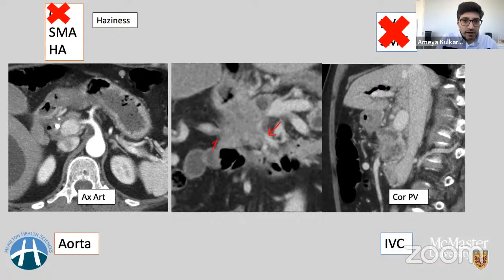If you see this collateral or dilated channel on the right side of the tumor, it is completely getting obstructed. This is nothing but the first tributary which is joining the SMV. As the tumor is present at that confluence, even this is gone. And the same thing is happening here on the left side. One of the tributaries which is coming in is completely obstructed.